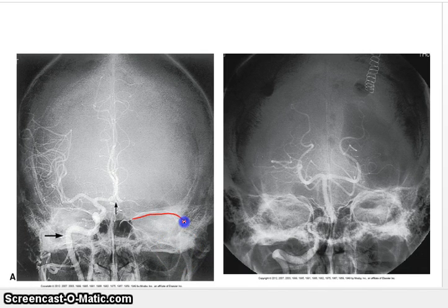So we'll start with the orbital rim. I'll just kind of try and draw it here. You don't see it really well, but about there is your orbital rim. So the top is the supraorbital rim, the bottom being the infraorbital rim. And then meanwhile, you have this chunk of bone. You can kind of see this line coming, and that is the temporal bone.